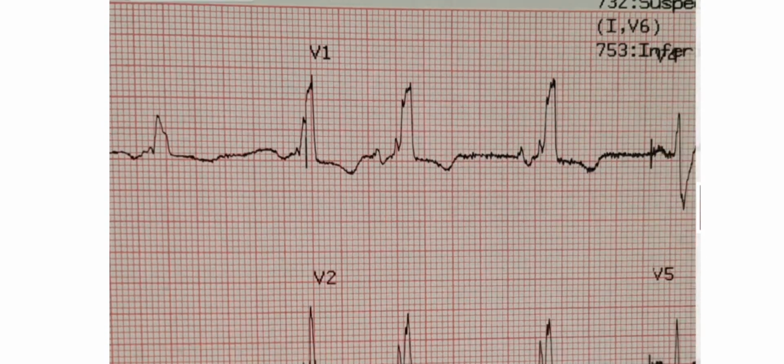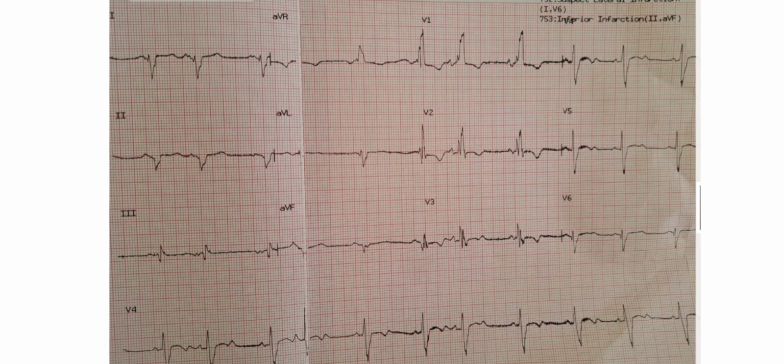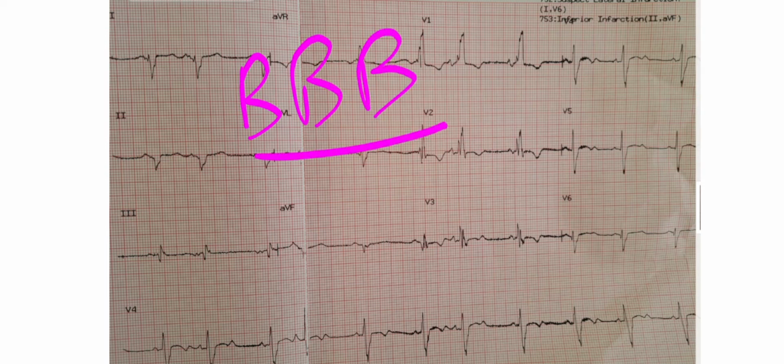Now we are certain that we've got a bundle branch block. At this point, we can discuss this patient with the cardiologist for a cardiac echo and all of those things, especially if the patient is stable, they don't have any hemodynamical instability, that kind of a thing. So we can discuss for a clinic date, because it's not an emergency, for them to actually get a proper assessment by a cardiologist. Ne?